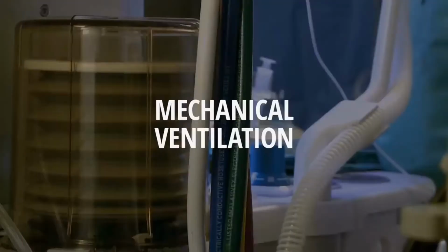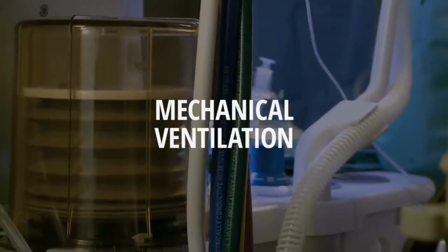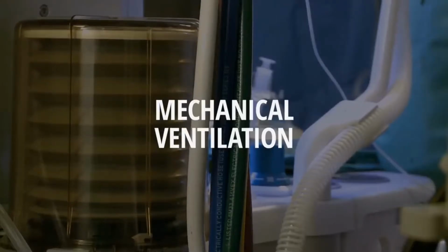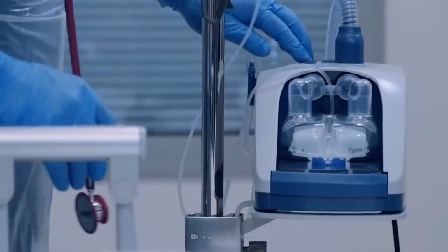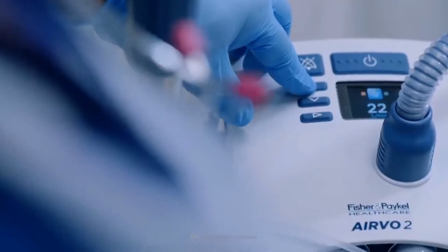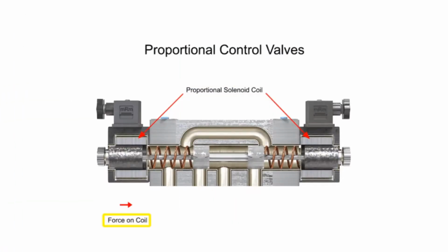Mechanical ventilation, referred to as artificially performed inhalation, is the administration or support of respiratory functions from outside the body, with the help of specialized machines. Those machines are called mechanical ventilators, and one of the main components is the proportional valve.